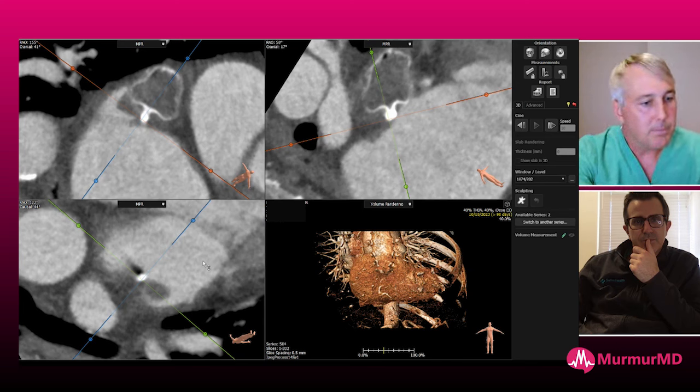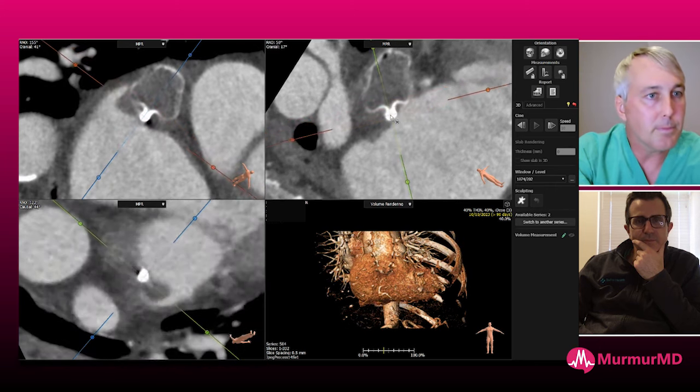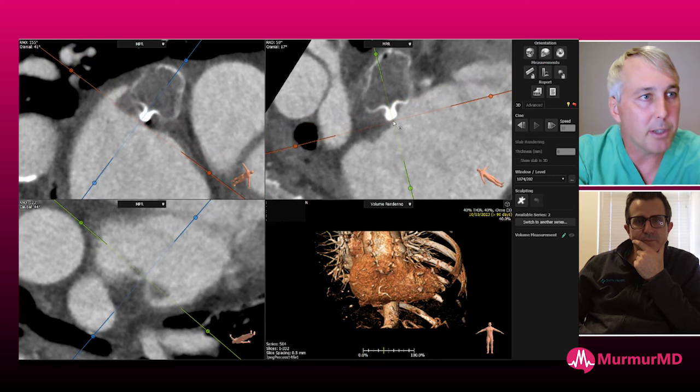All right, let me show you another case. Yeah, these are great pictures. That's very strong. I mean, it is a very noticeable difference. Yeah. So this patient has a good closure. You can see the device, it's all thrombosed behind it. But nonetheless, they had some DRT.